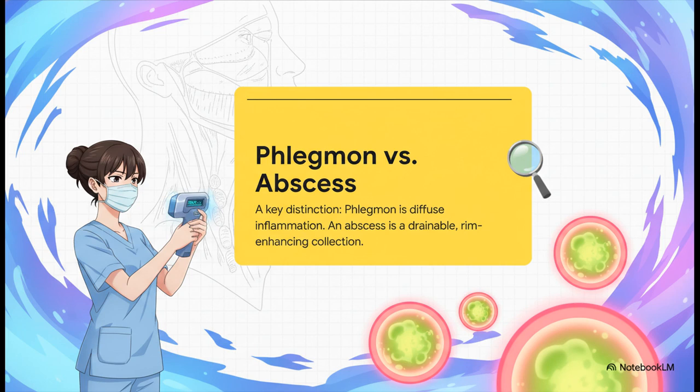Now, when you're reporting on these infections, the number one question the surgeon is going to ask you is this. Is this a phlegmon, which is basically just angry inflamed tissue, or is it a true drainable abscess? An abscess will show up as a nice, well-defined, rim-enhancing fluid collection, and sometimes using delayed imaging can be absolutely critical to make that distinction and guide the surgeon.